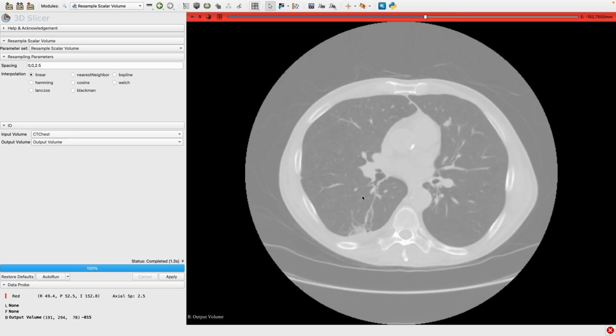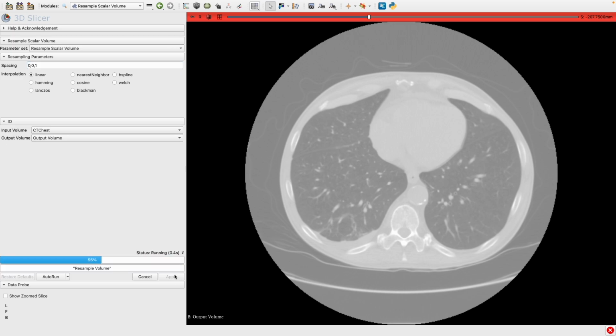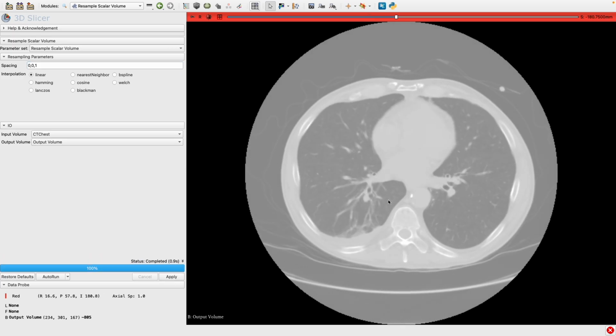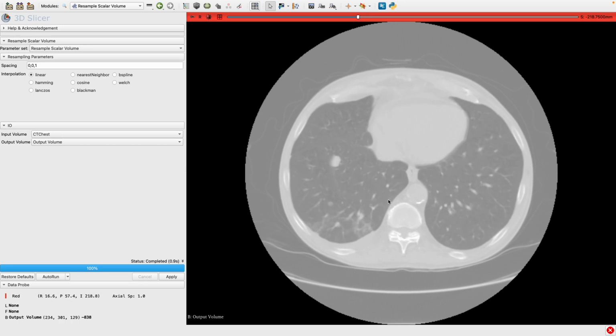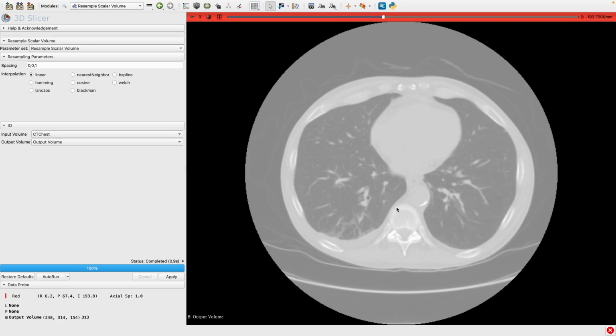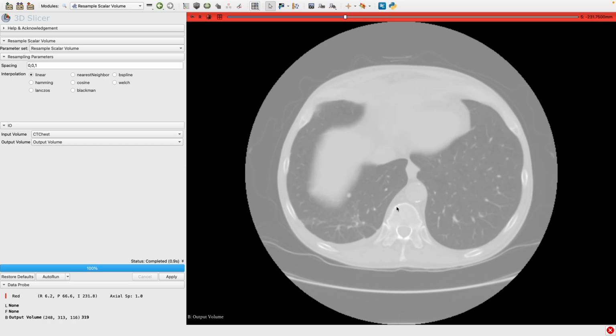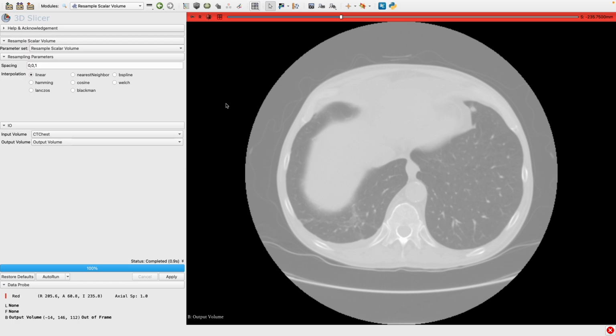They're going to be 2.5 mm slices, and I can try to change them to be even thinner, although the original was 2.5, so we'll see what that does here. So these are 1 mm slices, and that seems to be working there as well. So we have enough data for that to work with as well. And notice that this is only changing the width in the axial direction.